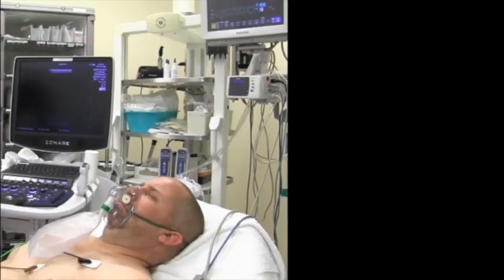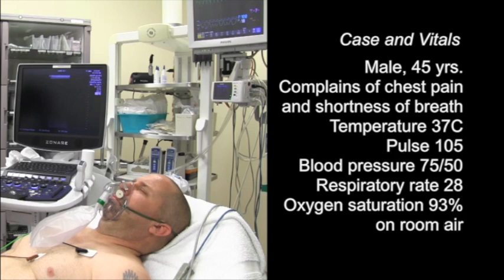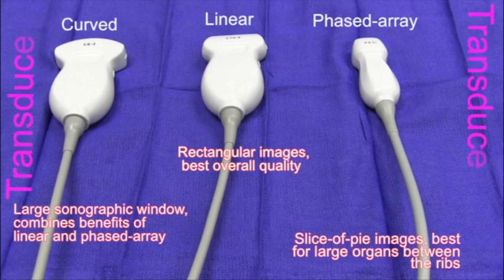I want you to be thinking about a patient who comes into your emergency department. He is a 45-year-old gentleman who complains of chest pain and shortness of breath. His vital signs are temperature 37 degrees Celsius, pulse 105, blood pressure 75/50, respiratory rate of 28, and oxygen saturation of 93%. There are multiple protocols that can be followed to elucidate the type of shock your patient has.